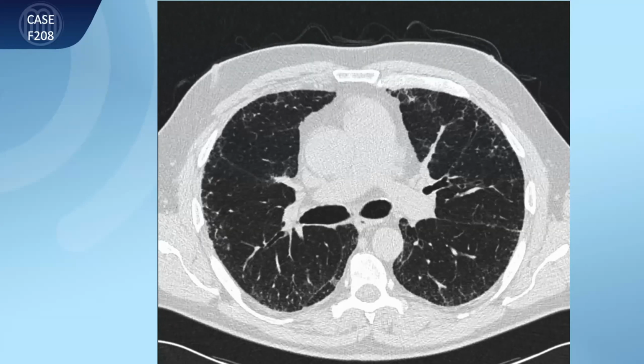Yeah, this one here. What is the predominant pattern here in this patient? Okay, let's stop here. The majority of you are in favor of reticular abnormalities, and that's completely right.